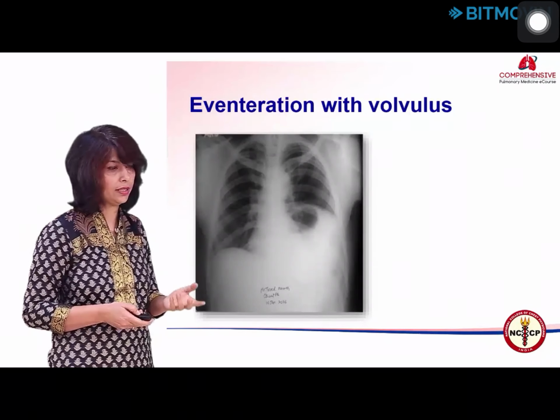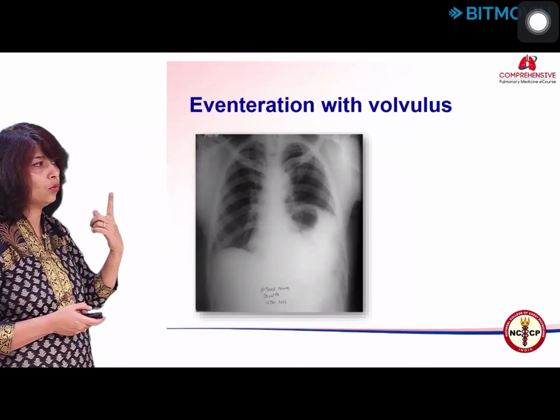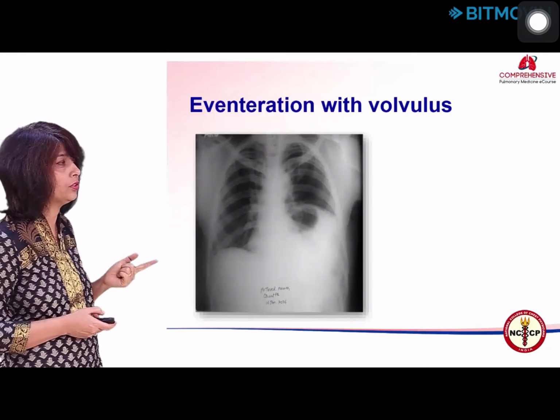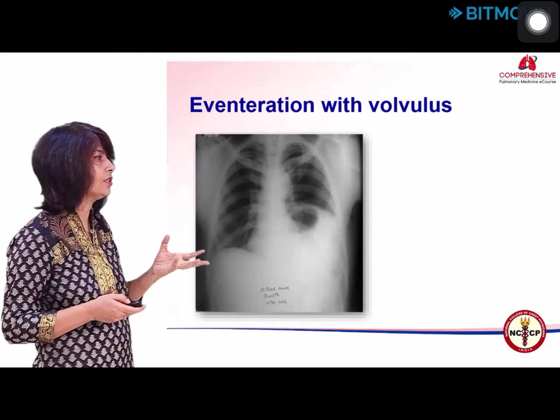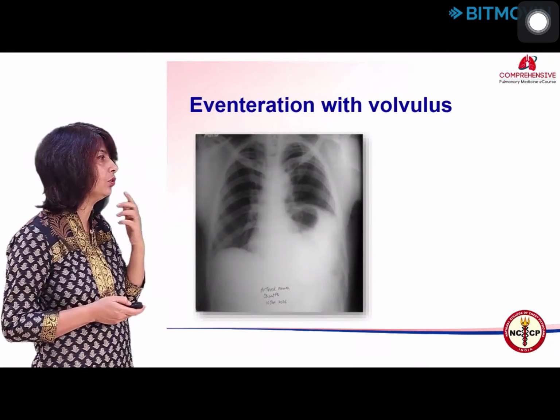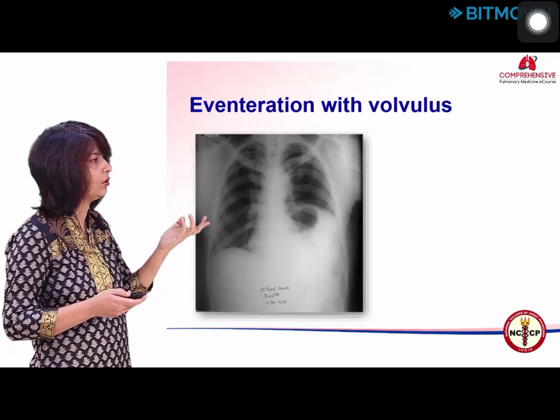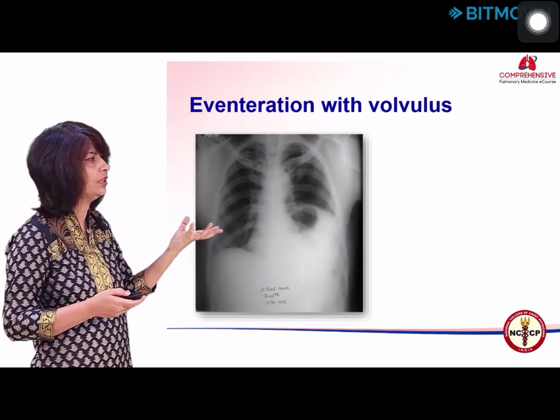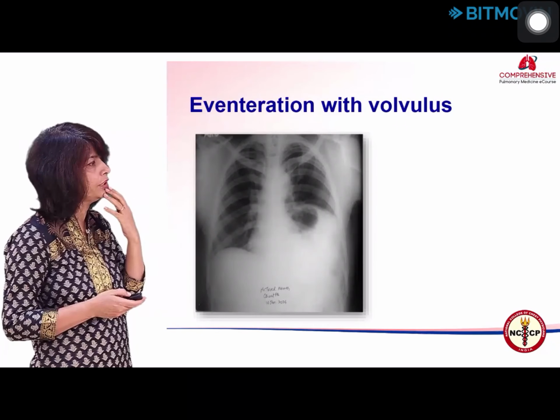What did we discuss? When we are in the lower zones, we have to always remember the abdomen, and in the upper zones we have to remember the neck. So we do have this, I don't know whether this is a raised dome of diaphragm, but earlier she showed a pleural mass which also had a convex upper border, which also had a mass lesion, which I couldn't see the diaphragm, and now this one also I can see the hard border through it, so posterior location is there.